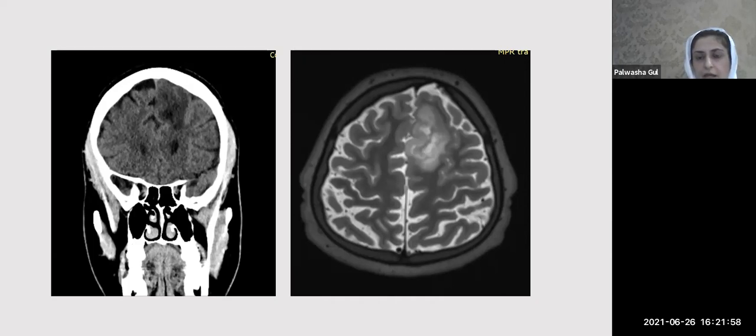glioma, okay? So the thing which I wanted to show you about glioma was this T2 hyper to intermediate dirty kind of signals in a glioma, okay? So always look at T2, okay? This will give you T2 dirty kind of signals, okay? Of course, if you're confused whether this is a glioma or anything else, you would go for MRS. But most of us would be sitting at places where we are dealing with 0.3 Tesla MRI, and thinking about MRS would be impossible in that particular case. So then you should look at T2 weighted sequences and look at these dirty signals to make you think about a glioma. So this was a non-enhancing glioma.